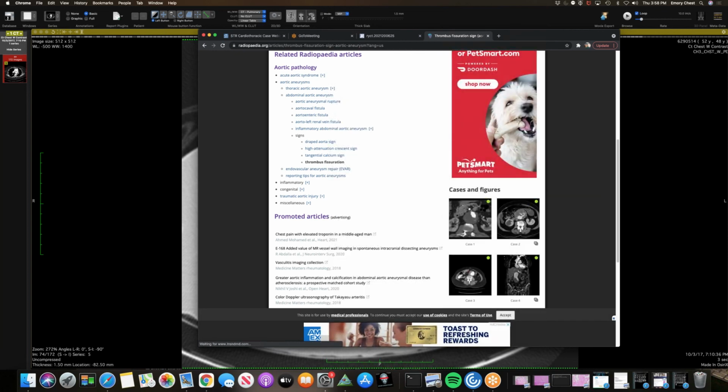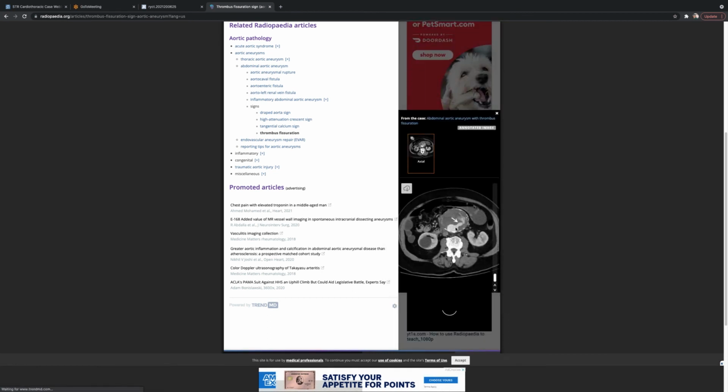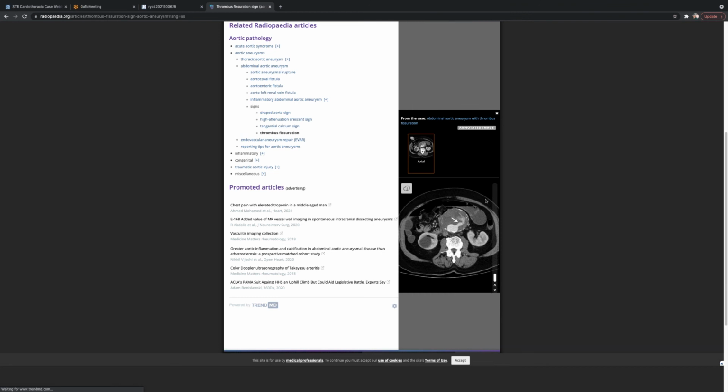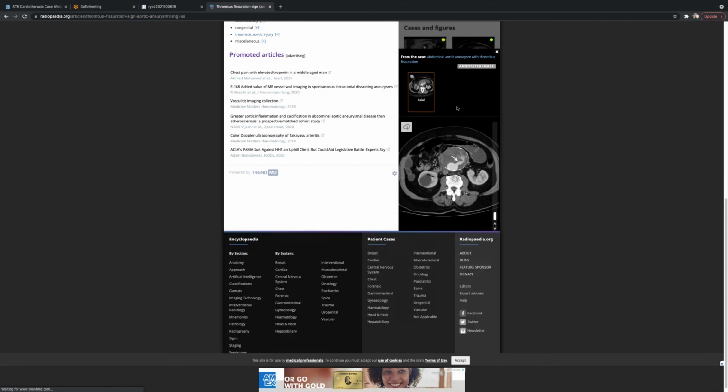Can you make that bigger at all? Yeah. So if you have a partially thrombosed aneurysm, an acute angled kind of fissure going into the thrombus is a sign of impending rupture. So that's just that the thrombus is breaking down and there's now blood flowing into it that's about ready to disrupt it. Is that exactly? Yeah. Oh, that's cool.